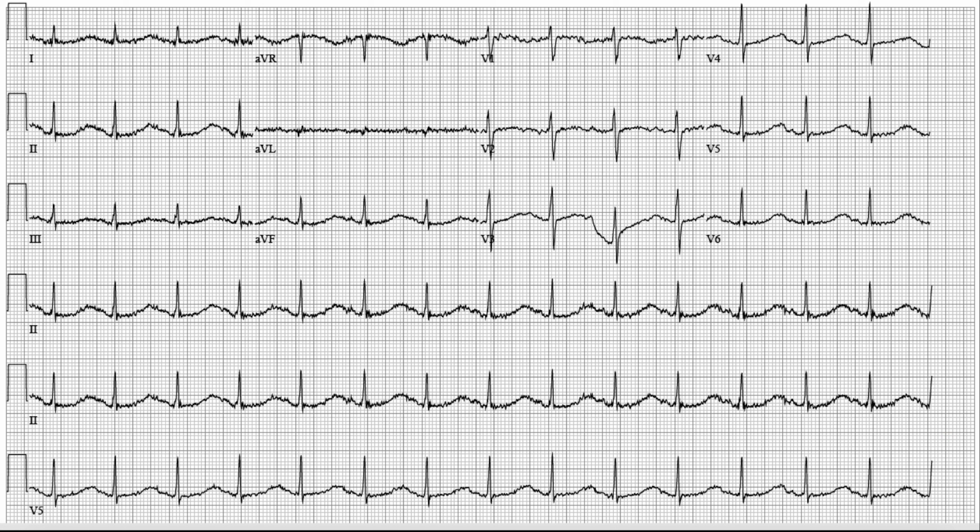I know that this strip is 10 seconds long, so there's going to be 6 of these in a minute. So I take the number that I counted, which is 15, multiply it by 6, and that gives me a number about 90. And again, we didn't quite get 15 in there, so we're going to go a shade under 90. So let's say like 85. What's computer say? Computer says 86. That's pretty darn close. Pretty good estimation. Rate. Rhythm. How about the rhythm?